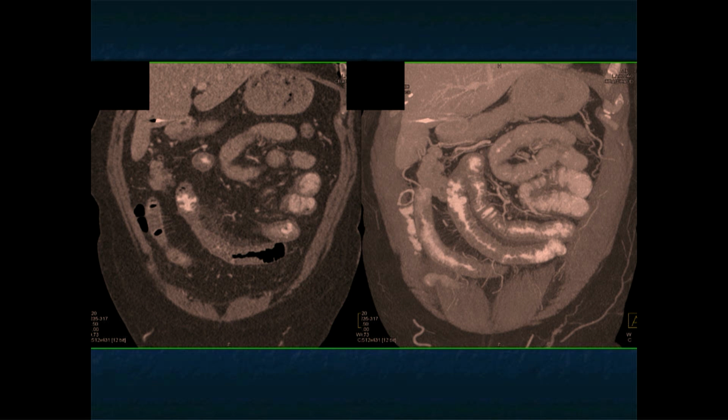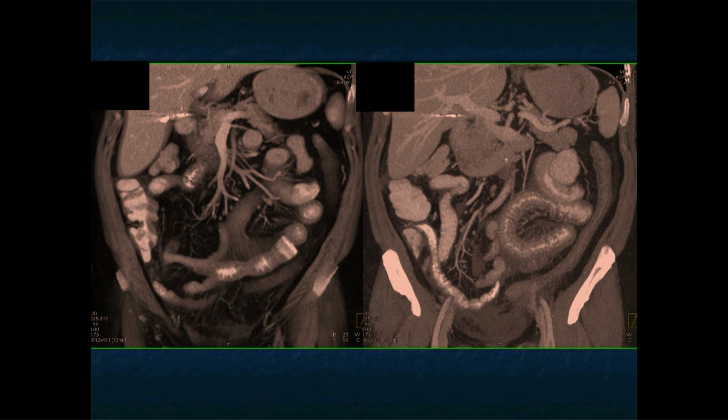Crohn's is very good at giving long segments of bowel involvement, very nicely shown here, and also shown on the coronal views. The comments we made before about looking at coronals is really ideal because when you're looking at axials, you're trying to build a vision in your mind. When you're looking at the coronals or the 3D, it's much easier to see everything a whole lot easier.